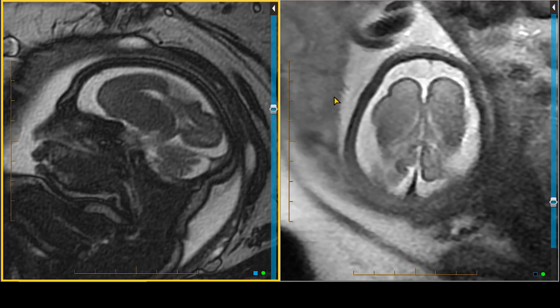The lack of sulcation prior to term infancy is very challenging to assess normal from abnormal. But this infant is, I believe, nearly 30 weeks gestation, at which time you should have more sulcation than this anteriorly. Also, there shouldn't be such an asymmetry between the frontal lobes, where we're seeing very little sulcation, and posteriorly, where we're seeing much more. And this right here is highly suggestive of an anterior predominant Lissencephaly spectrum disorder.